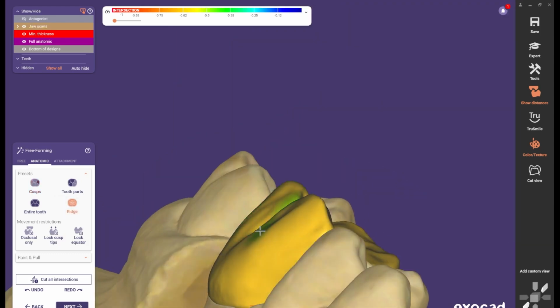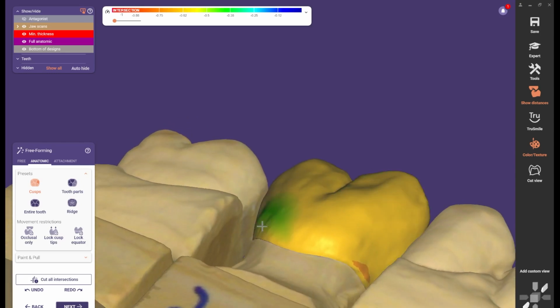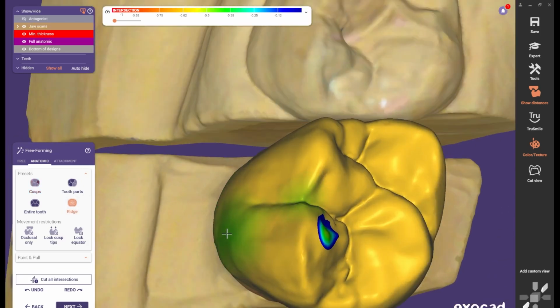Let me see which option is gonna let me. If you wanna move a part, you see it's gonna go green. So just play along with these and see with which tool you can select the area that you actually want to pull on. You don't just want to pull a little bit of parts, it's gonna take long. Instead of pulling with reach, maybe try cusps. See?